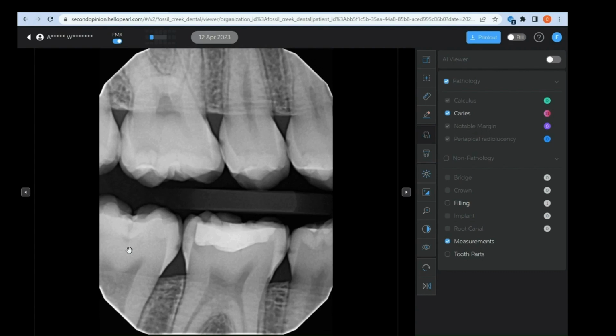I'm once again showing mom in an expanded view of 7 teeth here. And I'm talking about all of these carious lesions. And I'm walking through it. I click one button and I turn on the AI, and you'll see that these lesions pop up in a really bright and vibrant pink.